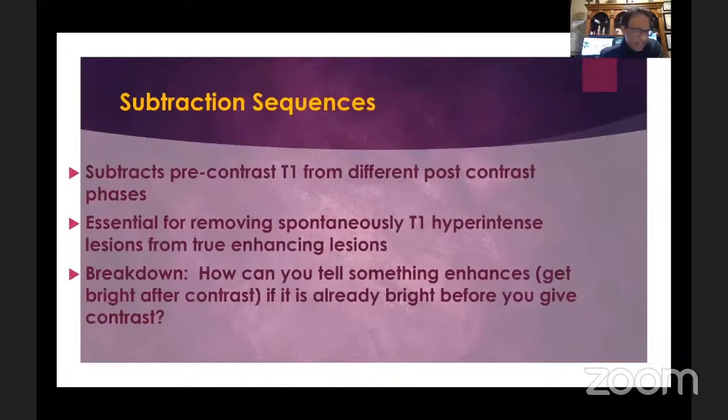As far as subtraction technique is concerned, it is grossly underutilized. It drives me crazy when I see outside scans where subtraction is not done. This is very simple. You just have to push a button and the machine does it for you. There is no extra table time or patient time. I think it's a crime not to do subtraction sequences when it is so easily available, and it makes a lot of difference in characterizing these lesions.